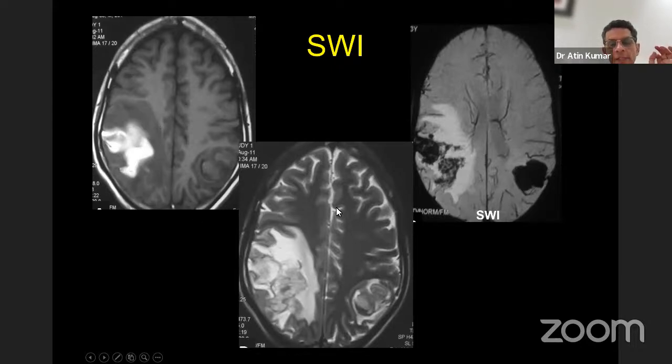On a T2 weighted image, this is a T2 because the sulcal spaces which contain CSF are appearing bright. This area shows heterogeneous signal, some dark areas, some bright areas, another area which is appearing dark here on a T2 weighted image. So on a T2 weighted image, most of the pathologies appear bright, that is hyperintense, like this. But again, hemorrhage, as it was appearing bright on T1, the hemorrhage usually appears dark on T2 weighted images. Again, there is complexity in this. It can appear bright, it can appear dark, but for all practical purposes, let's remember that hemorrhage can appear dark on T2 weighted image.